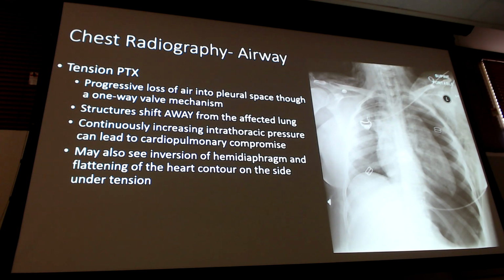Sometimes you may even see what they call inversion of the hemidiaphragm. So instead of it being like the hill, it's flipped out, right? Again, because it's supine and that air, that pressure is pushing it down, it just kind of inverts it temporarily. They stand back up, it'll go back to the way it needs to because the air will rise, right? The hemidiaphragm will come back. But just temporarily while they're supine, it can push it down and cause that inversion as part of that deep sulcus sign.